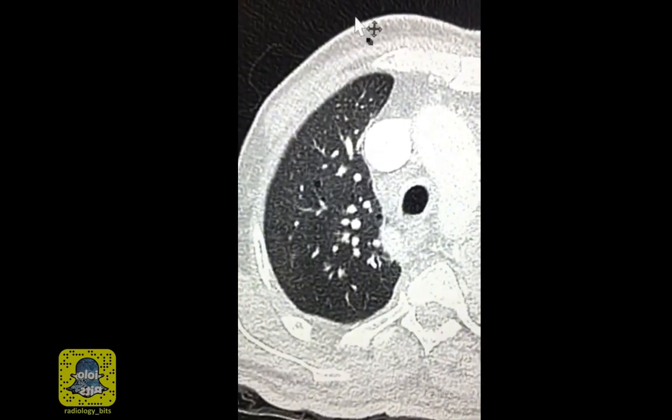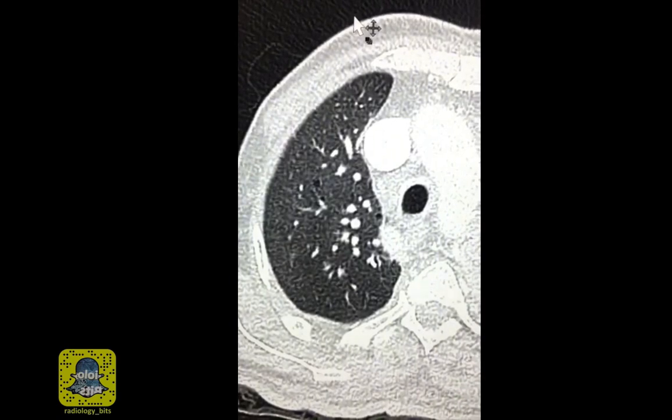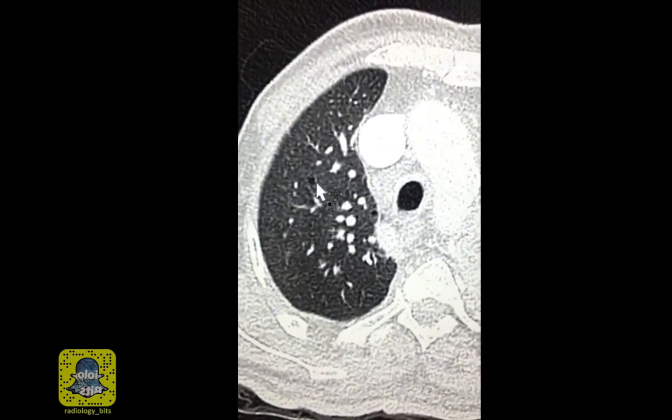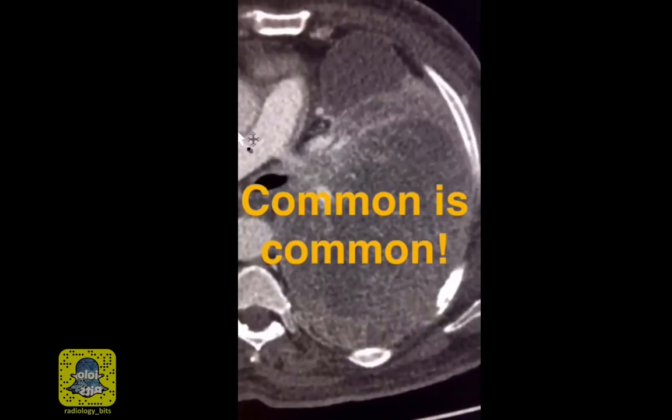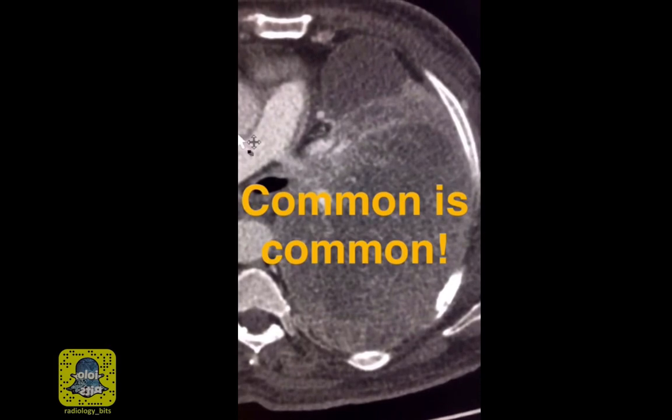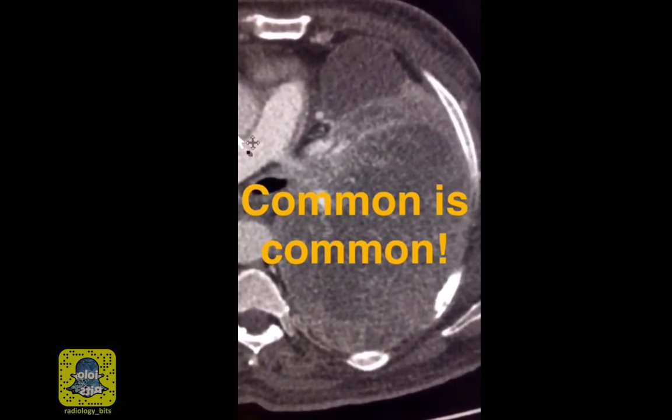Always look at the entire exam before proceeding to your conclusion. In this case, the hint of smoking was seen as emphysema. Finally, the most important point. No matter what you know, remember that what's common is common.